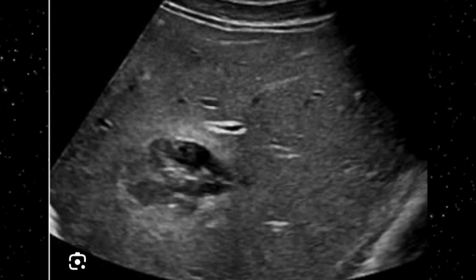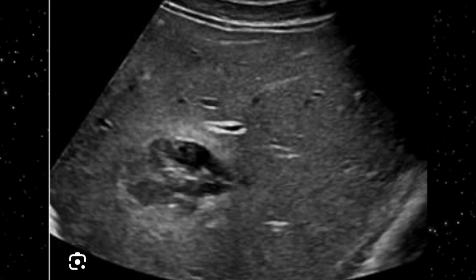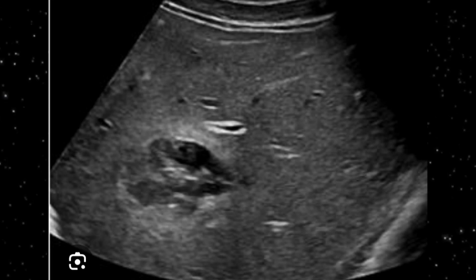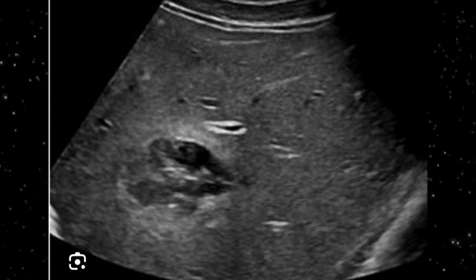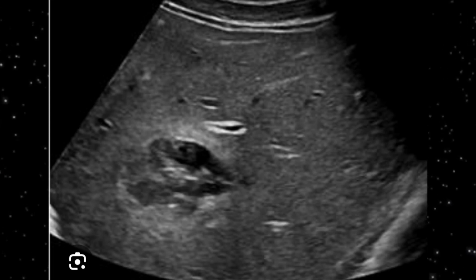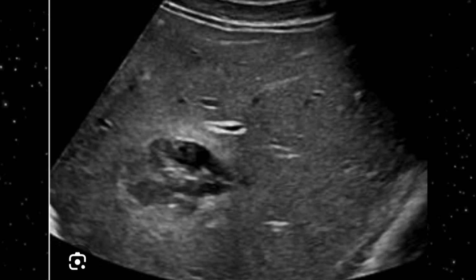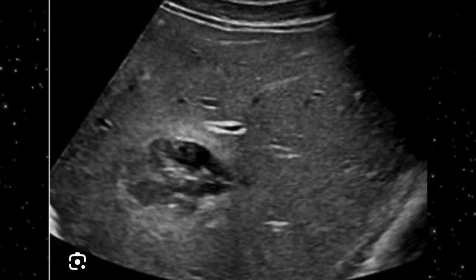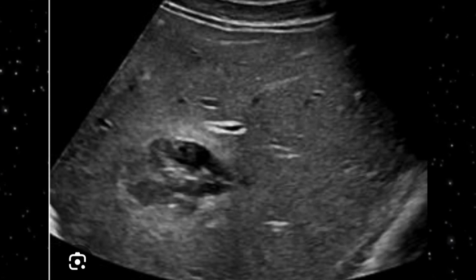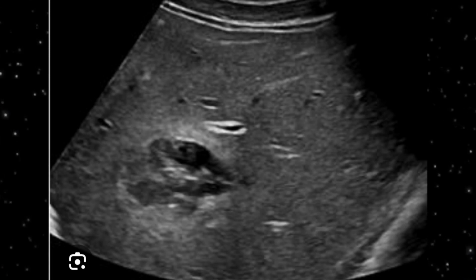Ultrasound is a reliable, easy and fast scan to pick up intra-abdominal bleeding, internal organ ruptures, hematoma or laceration, because it is quickly available and easy to approach. Therefore, always depend upon ultrasonography for prognosis and follow-up, because it will help you identify to what extent the hematoma has resolved and the hemorrhage has been absorbed.